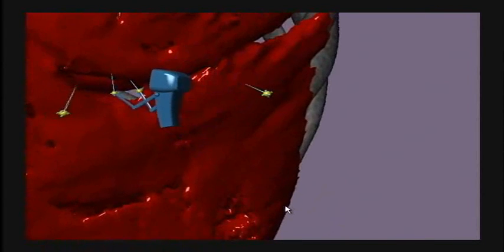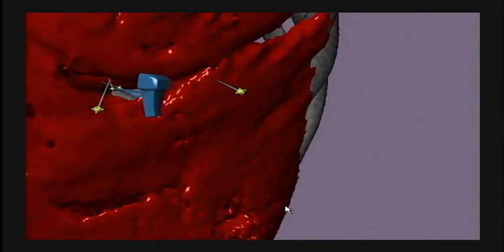THI's fluid scale translates naturally into collaborative visualization. It's easy to see what the remote user is looking at, not just from a position and orientation standpoint, but from a size standpoint as well. Here we follow the remote user into the recesses of the data.